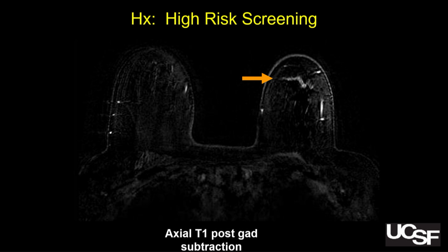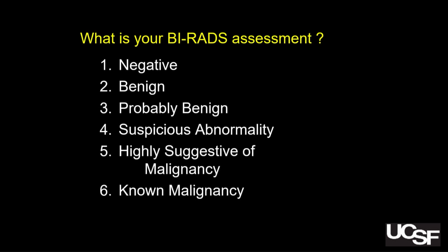So hopefully now you're kind of second-guessing that BI-RADS 4 suspicious. You're like, boy, that's a really strange-looking cancer, right? It's kind of planar and very, very long and wrong direction. So hopefully now people would vote maybe benign or probably benign, or ask a friend. Anyway, if I were to poll you, I hope we would get kind of a variation of responses.